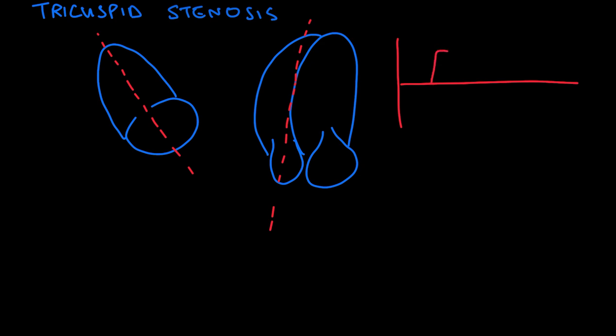You may see blood going in, and you may see some tricuspid regurg, and then you may see something like that. So this up here that I'm shading, that's blood flowing through the stiff tricuspid valve, and then this nice rounded jet down below, that would be your tricuspid regurg. And the reason I've shaded this in red here, this is a continuous Doppler, not a pulse wave.